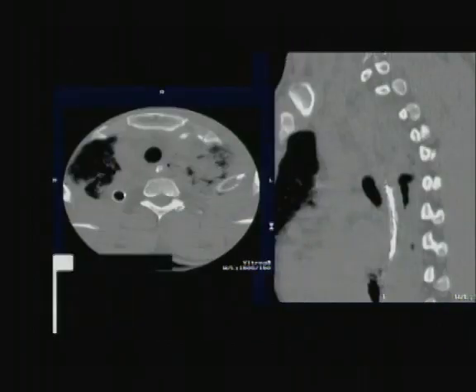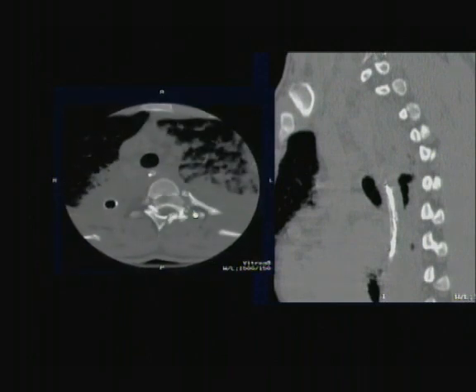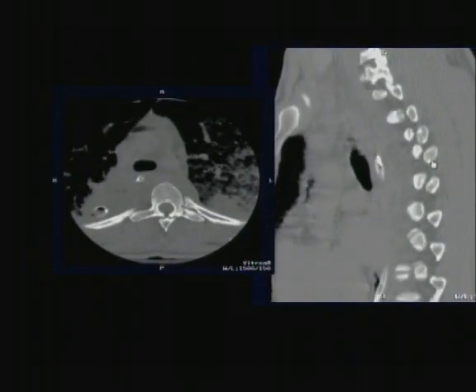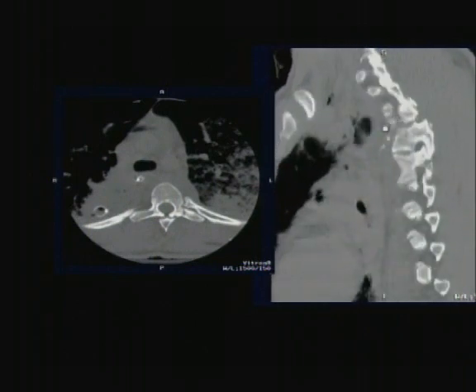If you do a penetrated view, you can see the fracture, and you can see it on the lateral view, but we're never satisfied because you cannot read the extent of the injury from plain films. You have to go to CT. And please concentrate in this area and look at the anterior columns and the posterior columns. You can see it is a devastating injury involving both columns. This is the sagittal reconstruction, and again, you can tell the extent of the injury.